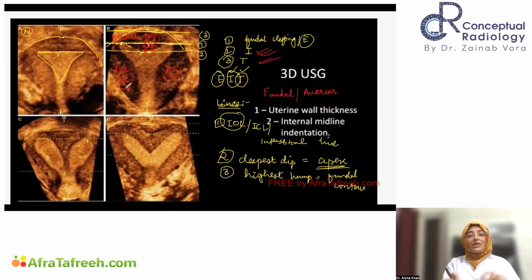If we want, we can measure the lateral wall thickness also by drawing perpendiculars.